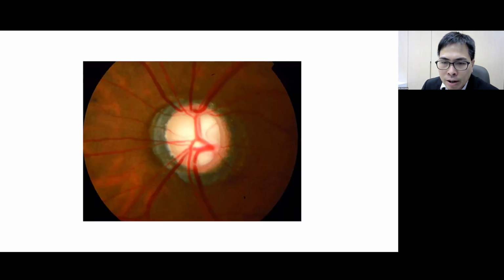We often see this scenario in patients with glaucoma, and sometimes we may then say, hey, the disc looks pale. I would like to highlight the point we need to study here is that in glaucomatous optic neuropathy, although the disc here may appear pale, the residual neuroretinal rim remains pink. So when we comment on the color of the optic disc, pay attention not to the cup, but to the rim, because it is the rim color that matters.